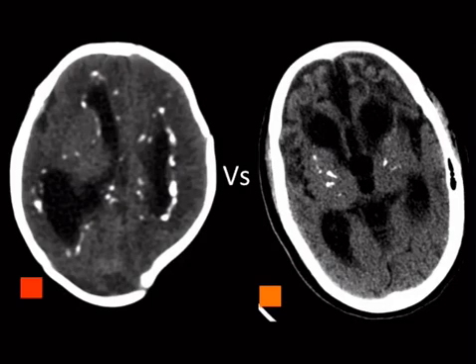On the red, you can see that there are calcifications that are centered around the ventricles, periventricular, you might call them, and then on the orange, they're primarily centered in the basal ganglia. So on that alone, you should be able to give the two main things that do this.